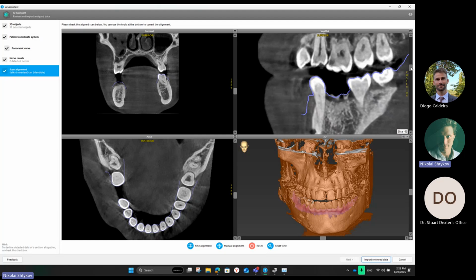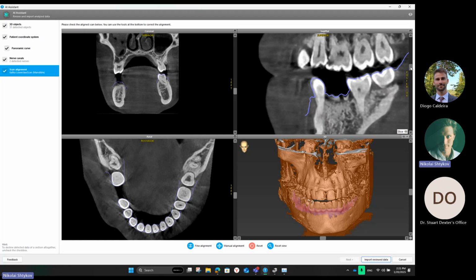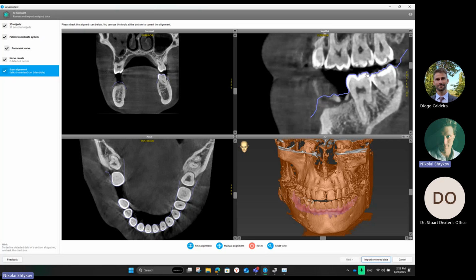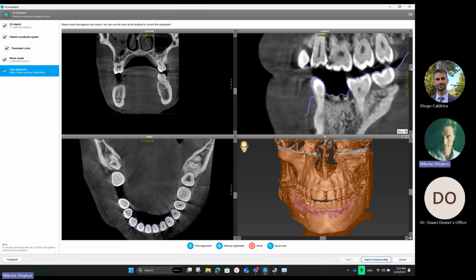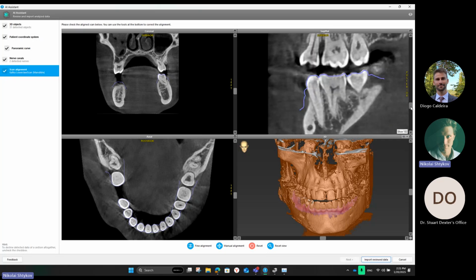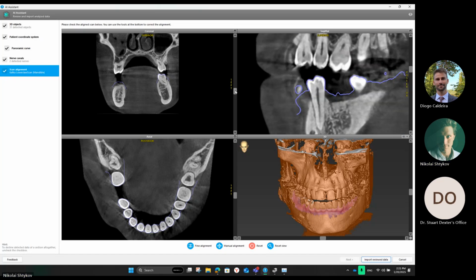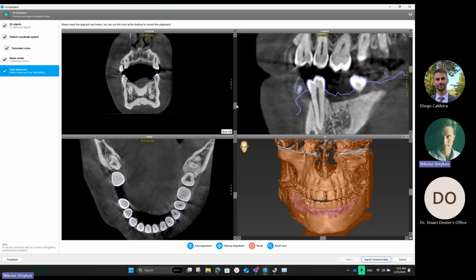But you don't need to check only one side. You need to check everywhere. For example, we also have the fissures, they are repeating. So everything is all right, I like it. And here as well.